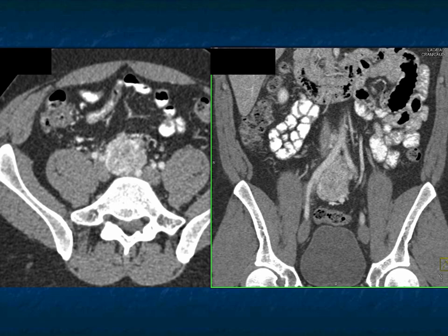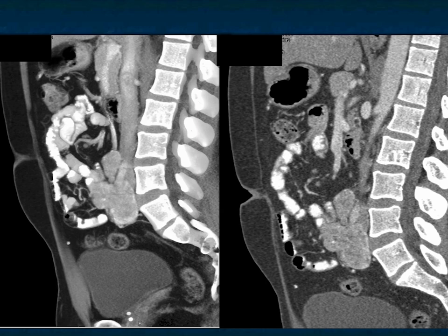And again, when you're looking for a pheo and you don't see it in the adrenal glands, scan through the bladder. We've had a few cases of bladder pheochromocytoma. There's an article in Abdominal Radiology this past month which shows some very nice examples of that. And here it is in the sagittal view. You can see the tumor, a really nice case.